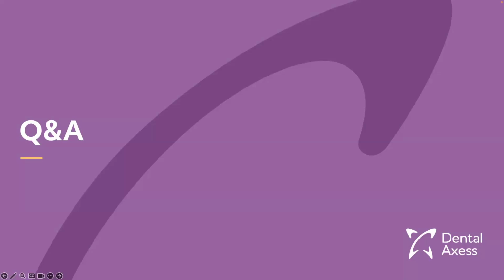trimline cut, for example. Another question here around the number of stages. So what if I don't want as many aligners in my treatment plan, or at least my patients? I think that is what they're talking about. That is another good one, because in some cases they just want to reduce the treatment plan. Trying to reduce the aligners means we are going to make the treatment plan shorter.